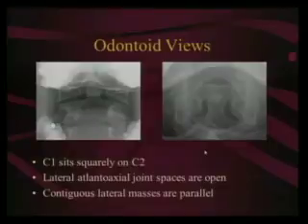The quandary comes in skeletally immature patients where the os odontoideum is not fused. Those patients usually have to go to MRI to look for ligament injury. Fractures at the base of the dens, or type 2 dens fractures, are unstable fractures. Those are scary fractures. The reason why is, if there's a fracture through this line, through the base of the dens, and the patient's head moves, then that can move as well. So 1s are stable, 2s are not stable, 3s are stable depending on how complicated they are.